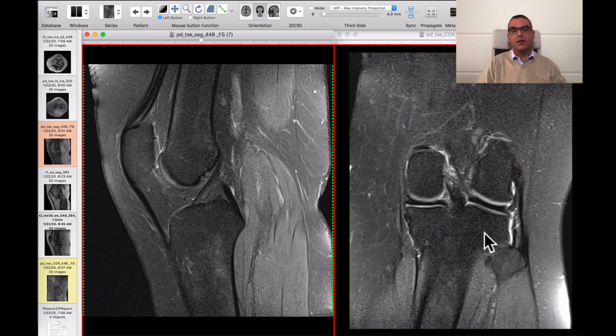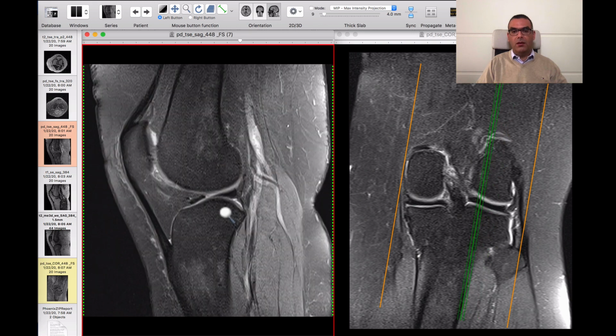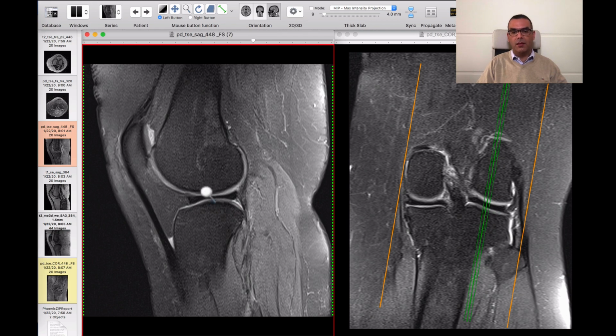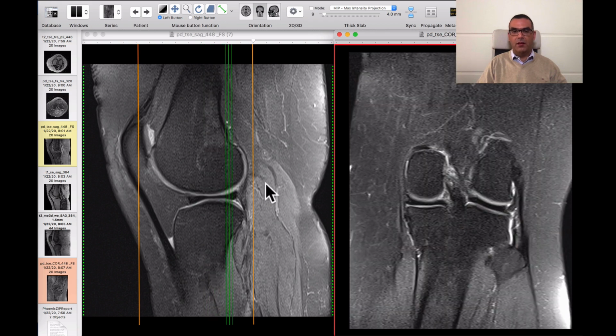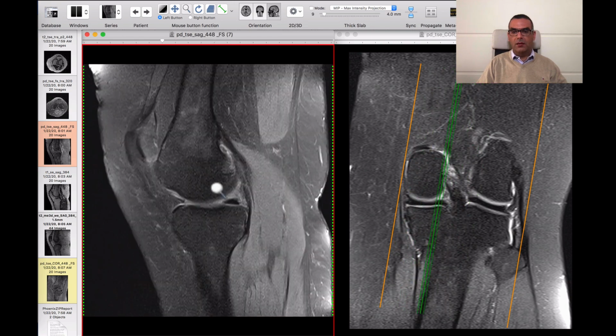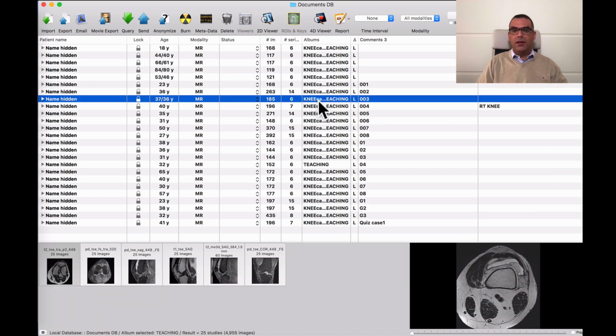Most of the discoid meniscus occur on the lateral side, but oftentimes you can also see a discoid medial meniscus. So take care when you see in more than 3 consecutive cuts at the sagittal, the rectangular appearance is persistent. You can just suspect a discoid lateral meniscus, and you can verify this very easily at the coronal scan. So this patient had the area of the patellar chondromalacia and the discoid lateral meniscus. Now let's begin addressing more complex cases.